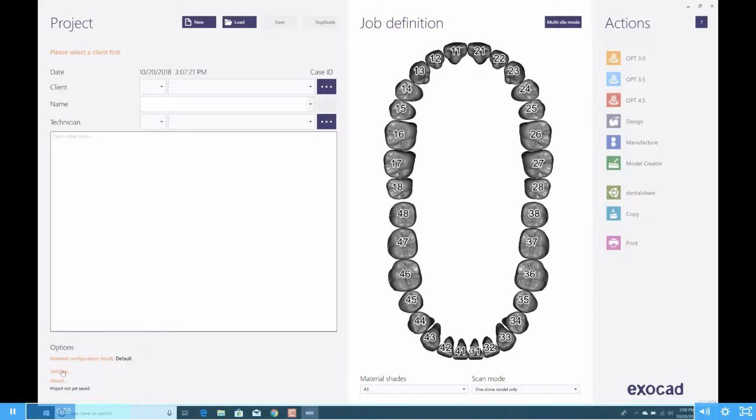a lot of time on, okay, because most of the time I would suggest you use the material configuration as default, right? Because it's just a matter of parameters. We will talk about that in depth later, because remember, in EXOCAD you can always have the freedom to change the parameters as you want. You don't have to do it just here, okay? You can do it later.